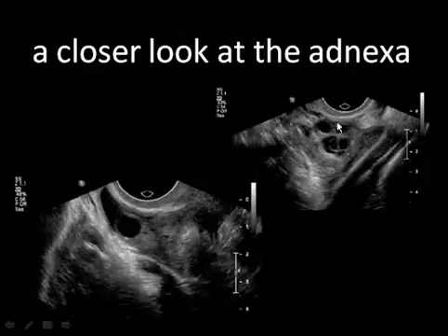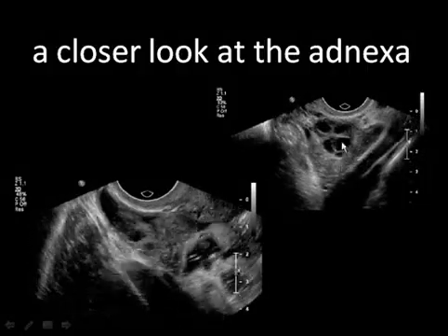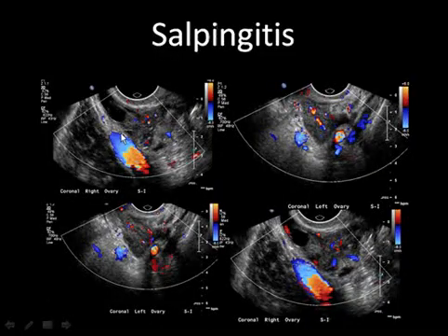On the other adnexa, we see a normal ovary, but again, all this extra soft tissue that is adjacent to the ovary. Doppler of this extra soft tissue demonstrated increased vascularity, excluding blood or pus as the etiology, and helping us make the diagnosis of inflamed fallopian tubes in the setting of salpingitis.